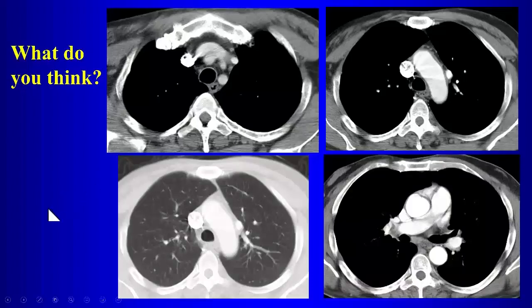See it? What is that vessel? Left SVC. Well, that's the question. Is that a left SVC or is that something else? If it's a left SVC, where should it go? Coronary sinus. Yeah, it should drain down to the coronary sinus. Do you see it here on this image at all? No, so it's not coming down, it's going up into the left brachiocephalic vein. And you can also see branches of pulmonary vessels coming into this vessel, right? So what is this vessel then?